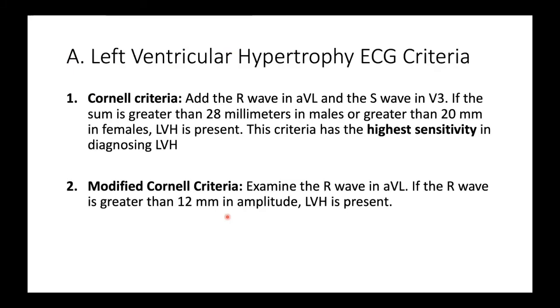Now let's go to the various criteria for LVH. This is the most common thing which you will be seeing in your day-to-day practice. It's not the RAE or LAE, it's the LVH. And most of you will be confused. Many of you, when asked in exam, may not be able to tell. And most of you will tell the Sokolow-Lyon.